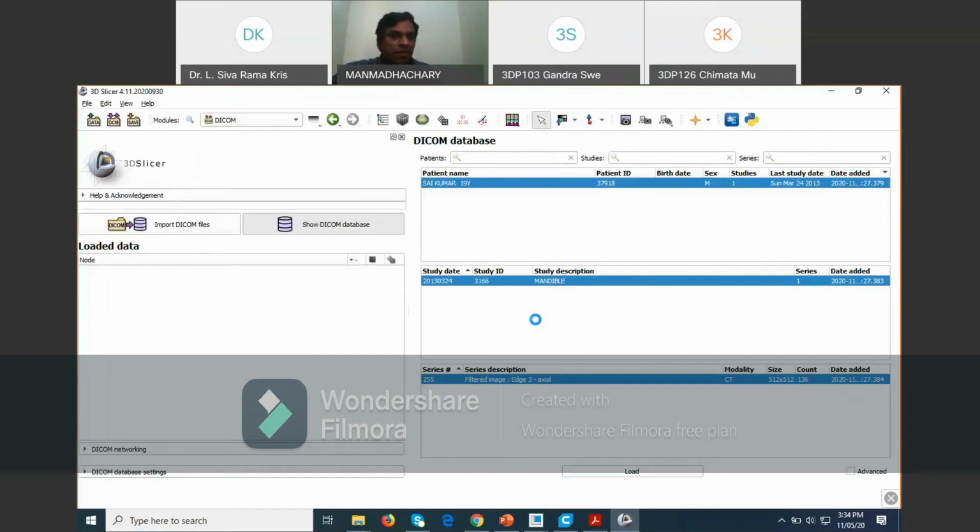Okay, get next. And now we are going for the next module, volume rendering. Go for the next module, volume rendering here. Just go for the volume rendering. Okay, somebody is shouting. Sir, please repeat. Sir, how to import? Please show again. Okay. Yeah, I'm repeating once again. Please follow with me.